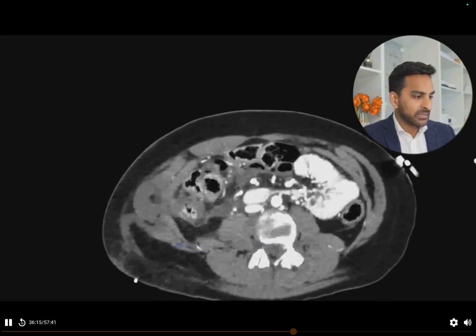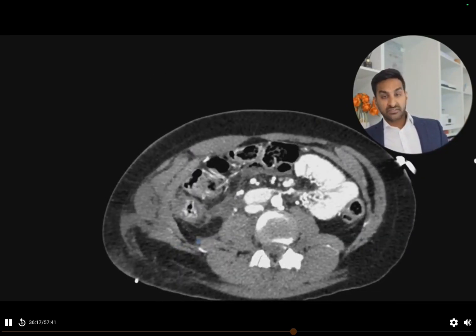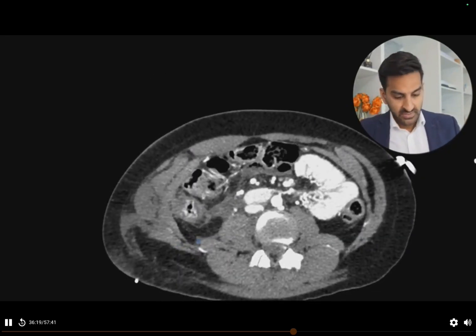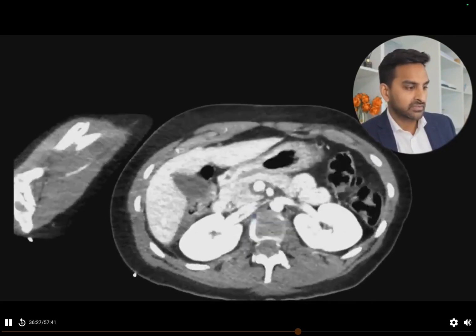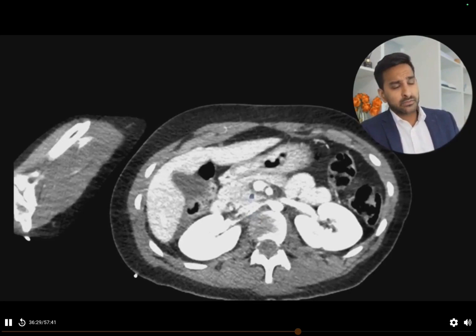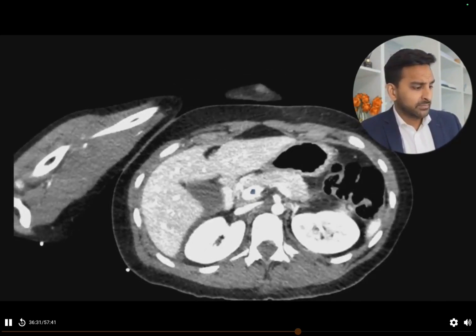And so what's happened here is that it was such a significant deceleration injury, the seatbelts got tight, it's tried to hold them in, and it's increased the intra-abdominal pressure and resulted in these quite significant injuries and the hernia coming through the side of the abdomen. So this is all not great news, is it, for this person?